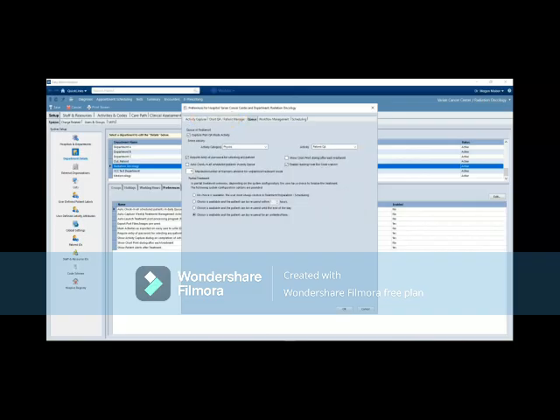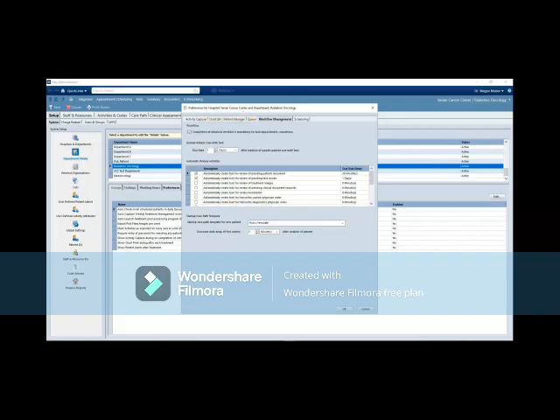Select queue. Certain options here reflect settings on the treatment queue. For example, choose to capture Plan QA activity automatically. Choose category and activity. Select applicable options pertaining to the treatment queue. Select Workflow Management. Settings on this tab help streamline the automatic workflow for certain activities and tasks.